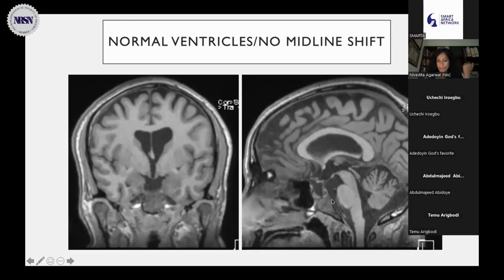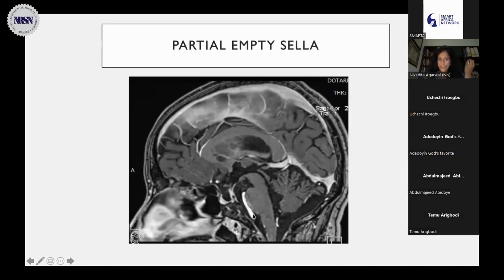And I'm looking at the hypophysis. It probably is a partial empty sella. You know, going back and forth. I'm not seeing anything. Then it hits me. Visual loss, 34-year-old, childbearing age, obese. So that's your, and that's when I gave gadolinium.